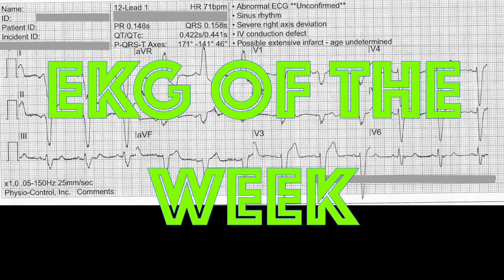EKG of the week. We're back with another EKG to run through and look at some interesting stuff. This one is a bit of a head scratcher, and this is one that you maybe don't see, or maybe you see it more often than you realize, but you certainly don't think about very often. So let's take a look at this EKG.